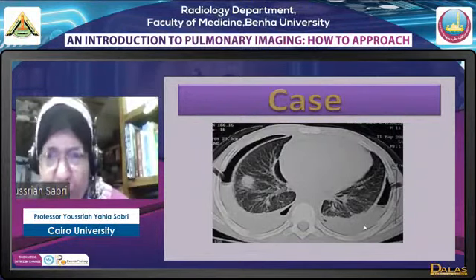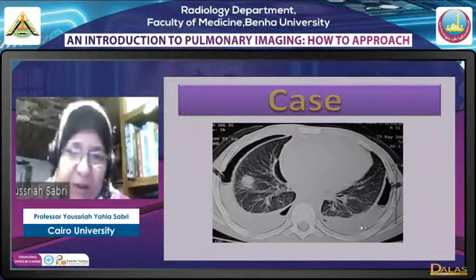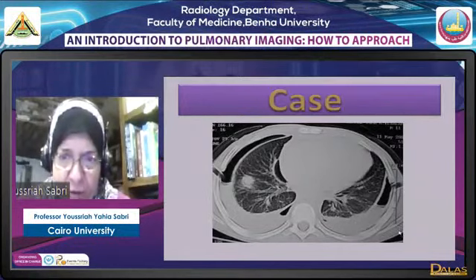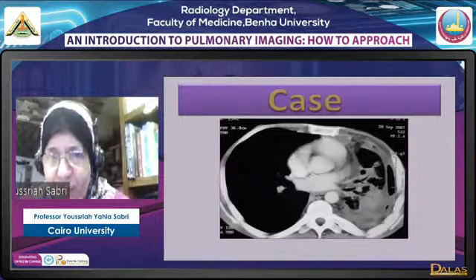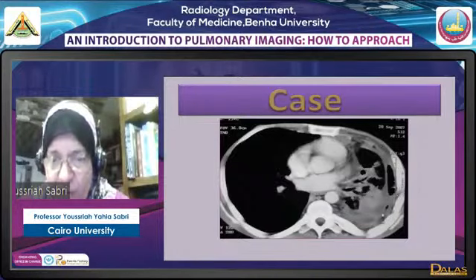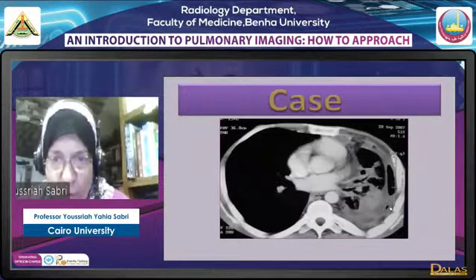As I said before, if we see a loculated hydropneumothorax related to an inflammatory lesion, we have to consider a bronchopleural fistula, especially if there is no tube put. Here we have a bronchopleural fistula. There is marked complicated pneumonia and a loculated hydropneumothorax without a tube. This is a bronchopleural fistula.